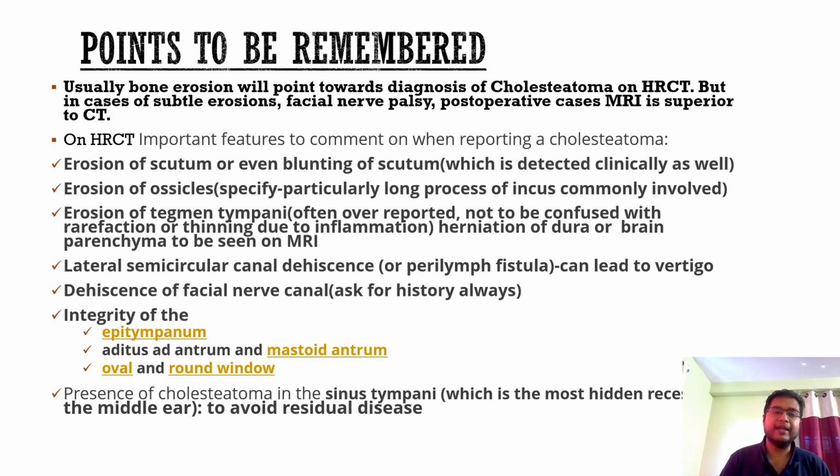Erosion of the tegmen tympani. This is a very important statement that I've seen commonly being reported. It is overdiagnosed. Erosion of tegmen tympani, even in case of non-cholesteatoma, is given as erosion of tegmen tympani. It turns out to be a simple case of CSOM and no.